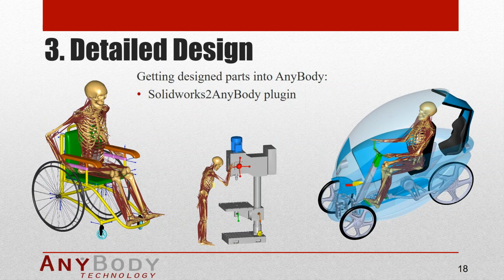We also export surface properties and colors and stuff like that, so that the models that you get into AnyBody look really nice. So that way you can couple your biomechanical or musculoskeletal analysis with the design process that's taking place in the CAD system in a very easy way.